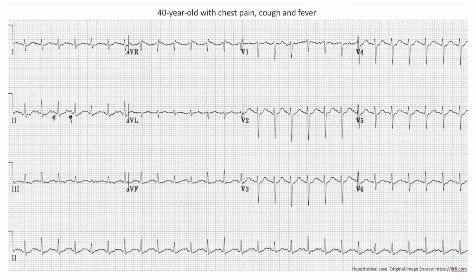If you closely pay attention, you see these second notches which represent the P wave, and these are upright in lead 2 and inverted in AVR. So the axis of the P waves is normal. Notice how the P waves all look pretty similar.